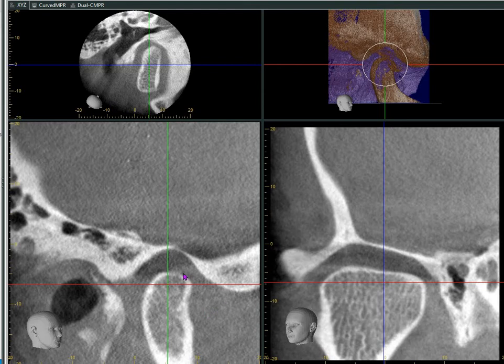The cartilage protects your brain, which is seen here, with help from a healthy articular surface of skull bone. This is your articular surface, this is your skull bone that protects your brain tissue from the condyle of the lower jaw.